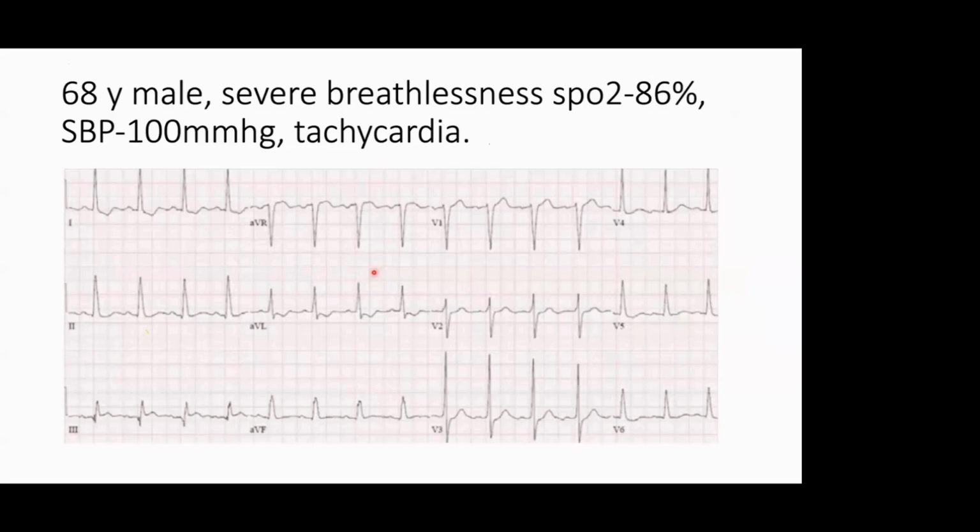Pulmonary embolism. No, this is ischemia only. I think pulmonary embolism we do not include; the miscellaneous session will include all those things. This one is ischemia only, cardiac ischemia directly involving the coronary arteries. Lateral wall MI. No, it's not a lateral wall MI.